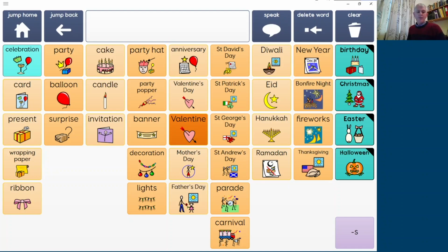Okay, so whatever your switch scanning method, one other overriding access addition that's worth considering is to make use of some auditory feedback. We'll quite often work with users who have poor vision or who struggle to maintain their view of the screen, to keep watching the screen, and it can be quite useful for a user to hear what they've got highlighted before they make a selection.